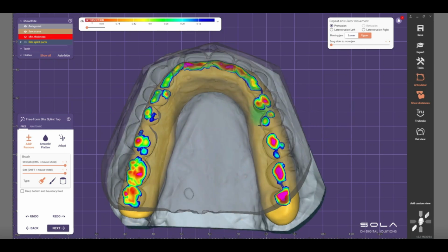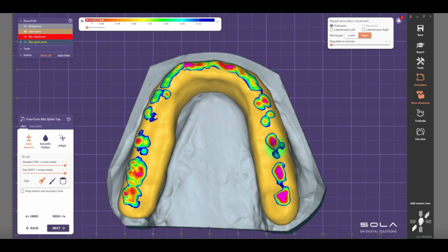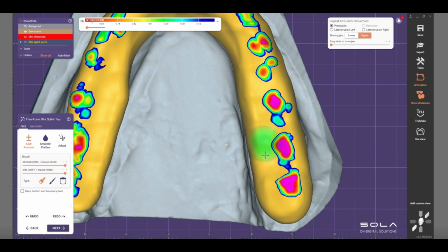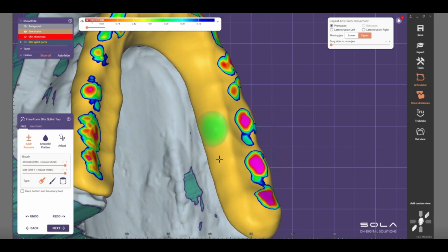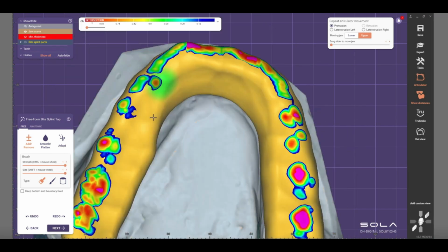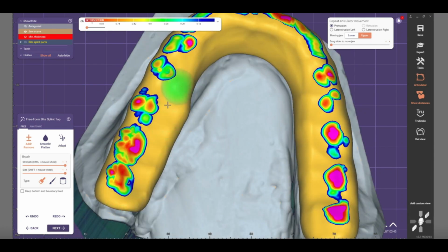I know we're adding a little bit more, but I'm just making sure that they're added and that the edge is made over here. Some of the labs needed rounded. I'll add a little bit over here, add it to this side, make sure that's added here, and make sure that the occlusal plane is really flat.